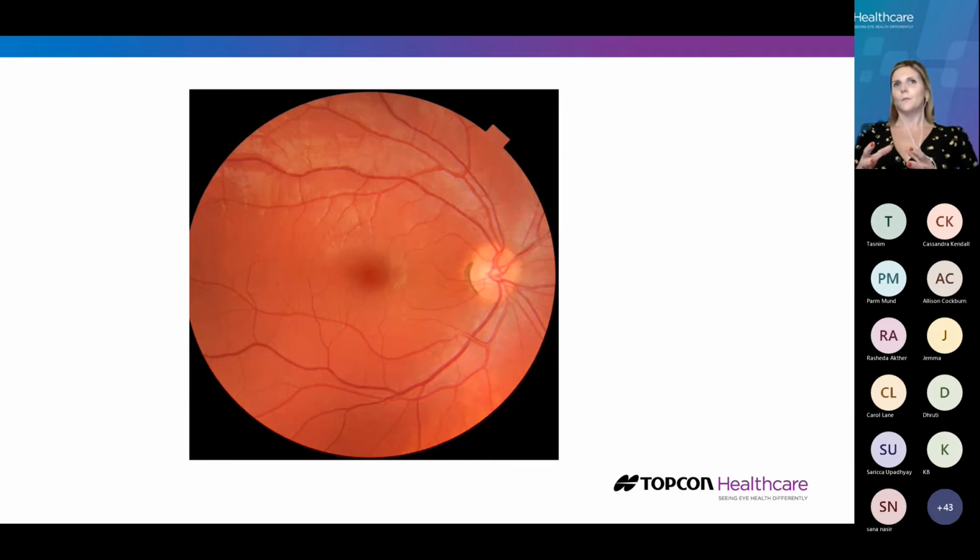Now, when we're looking at this fundus, we're able to get information. We can look at the vessels, we can look at the optic disc and the macula, but we're only seeing the surface, aren't we? So what we're going to do when we start to look at OCT is peel back those layers and take that deeper look at what we're going to be learning to visualize and interpret with our patients. It may be that we see even more information than we can already see on the fundus, just in more enhanced depth. So it's really important that we still remember as clinicians that we have a lot that we're building into our storyboard when we start to learn and interpret OCT. In all of the interpretation exams I've ever sat, I've always had more than one B scan or one image to look at. I've pulled all of that information together.